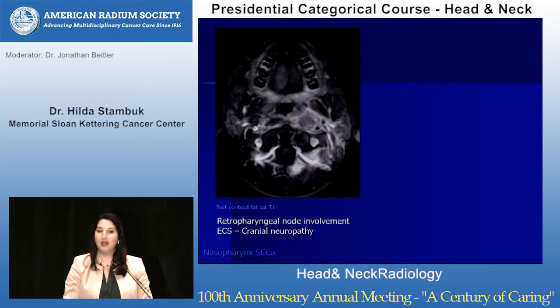Well, the first place that the lymph nodes drain in nasopharyngeal carcinoma are the lateral retropharyngeal lymph nodes, the nodes of Rouvier. And where do you find it? Between the internal carotid artery and the prevertebral musculature. Here's a normal node. Now, if you look at this opposite side, I agree this is a very ugly MRI, but there's a reason. This node is too big in an adult.